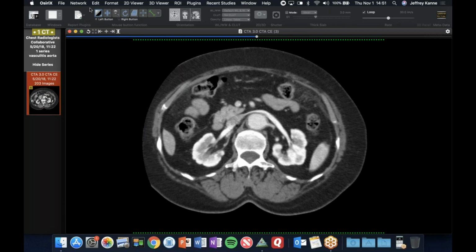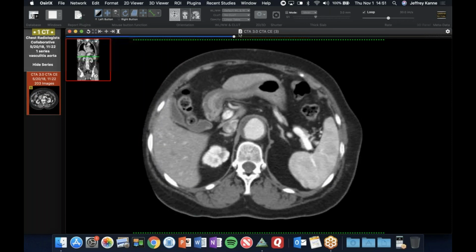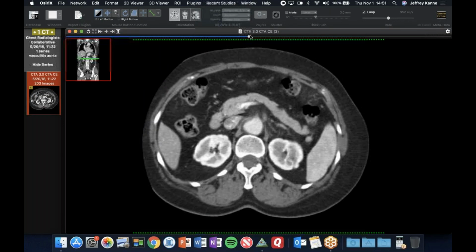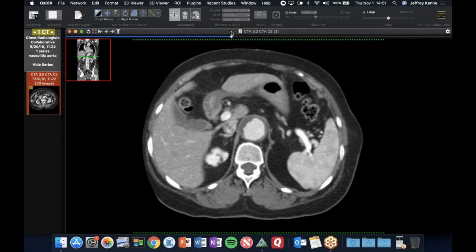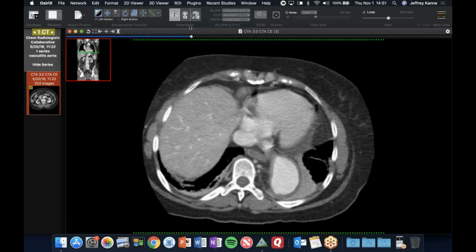But could it be giant cell that's only involving the aorta? I presume, but no one's going to go biopsy this. And she responded pretty well to some steroids. I believe that's what they treated her with. And no involvement of the pancreas or anything else to suggest IgG4 related disease? No, her pancreas actually looks really healthy, and it was very isolated. No other issues. I mean, that's why it's a conundrum.